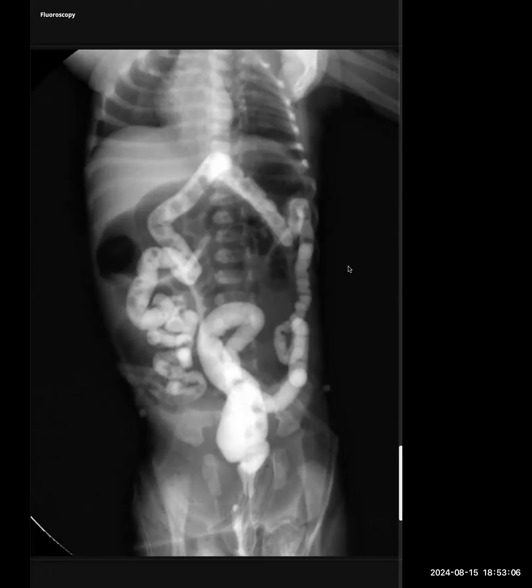I would inform these findings to the referring team, and would check the previous medical records of this patient for any history of cystic fibrosis. I would recommend further evaluation by contrast enhanced CT of the abdomen to look for other findings of cystic fibrosis.